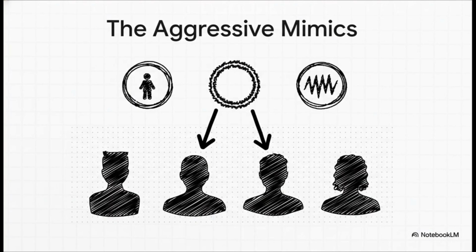Let's look at a really tough case. Say the clues are all pointing to something aggressive. We have a young patient, a blurry border, a hair-on-end reaction. The obvious suspect is a malignant tumor, like an osteosarcoma. But this is where the story gets its twist. An aggressive infection, or even a rare condition called eosinophilic granuloma, can show up with the exact same clues. These are the great mimics, and this is where the detective work gets really, really tough.